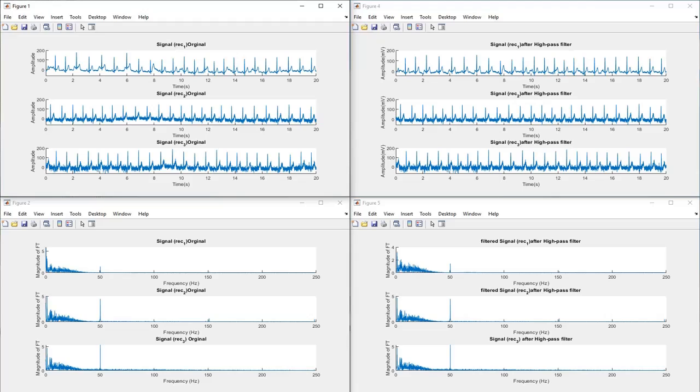After filtering, we can see the magnitude of the frequencies below 0.6 has been suppressed, and we can show it right now. Let's start off with this one. This one right here is the non-filtered one, and we can see in the frequency domain that we still have a lot of frequencies. We have magnitude right here between 0 and 0.65, or 0.67 actually.